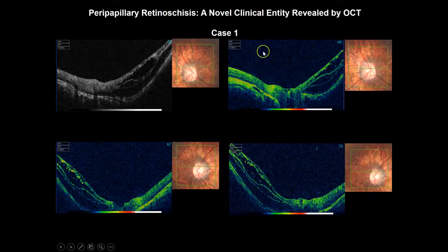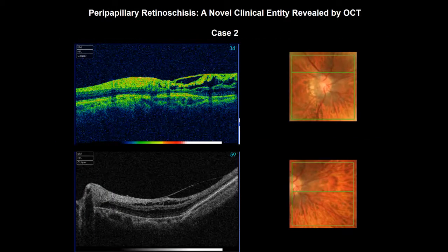Again, just reminding you, if we take images around the optic nerve head, amazingly, high myopes often have splits, retinal schisis. This is not unusual. I think we've seen about 25 of them. So as we start to look at high myopes for looking at splits in the macula, which are well known, you should also image the disc and look at the images of what's going on in the disc.